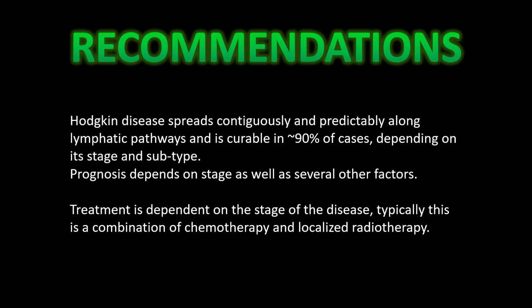So based off of the finding on the chest x-ray, a CT scan of the chest was recommended, which confirmed the presence of the hilar mass. And then from there, biopsy. And the biopsy confirmed the Hodgkin's lymphoma diagnosis. And remember, there's different types, subtypes, and they have different prognoses, and then of course staging. So the earlier the detection, the better the prognosis. So there's a lot of things that factor into it, and these may lead to a combination of chemotherapy or localized radiation therapy, but an oncological consultation is going to be the most appropriate recommendation for this patient.